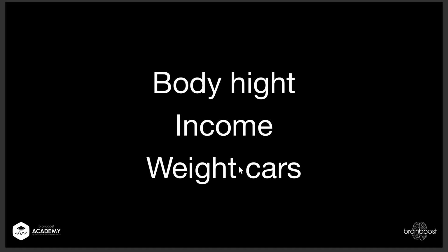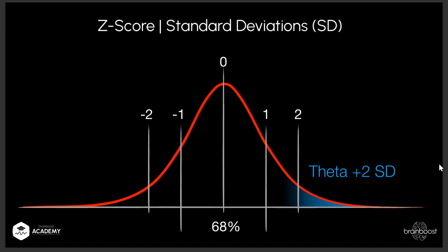Also, here, this is an example for theta brain activity, +2 standard deviations. So here I would say, okay, if somebody has +2 standard deviations theta, and we know this from the report you can generate with our software, that it gives you these brain maps, the heat maps, and shows you are you in a plus or minus range compared to a person within your age and your gender. This and eye state, eyes open, eyes closed. This means, oh, there's a lot of theta going on.